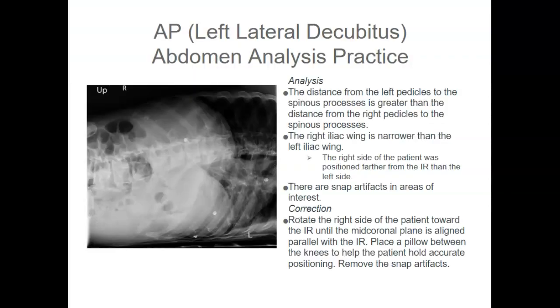So let's look at this left lateral decubitus practice analysis. This is a hot mess express. First thing is my eyesore, all the artifacts. If you can remove those artifacts, please do so. It takes away from your image quality, and it may be obscuring something that the physician may need to see.